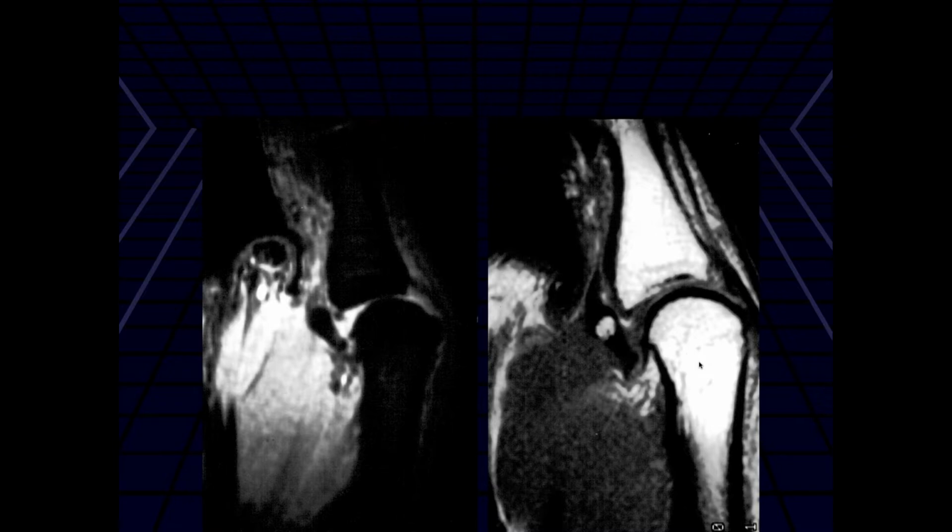All right. So looking, is this a coronal image or sagittal image? Sagittal image, right? I think we're looking at the volar plate of the first metacarpophalangeal joint, and it looks like, I think this is the second. Okay. I see a little bit of thickening centrally, and there's irregular signal. Is that an ossicle within the volar plate?